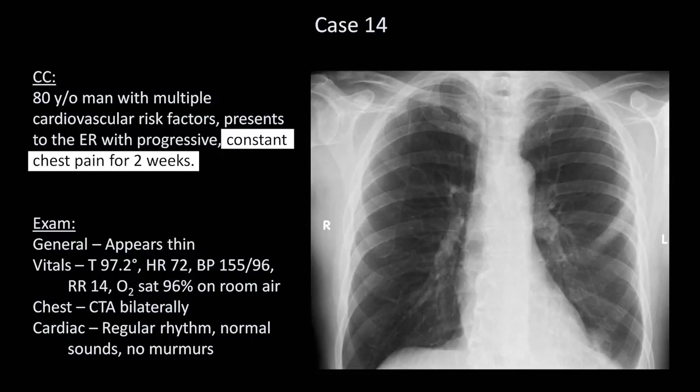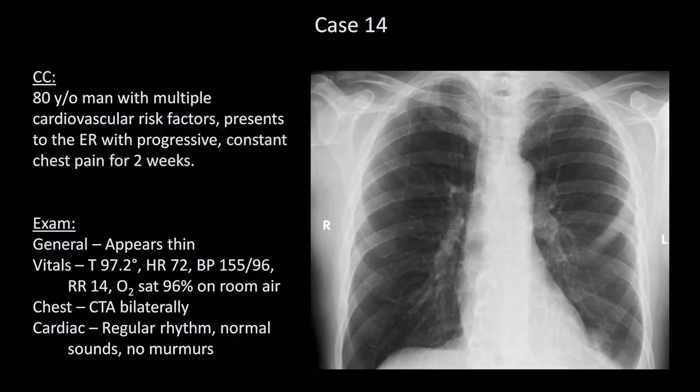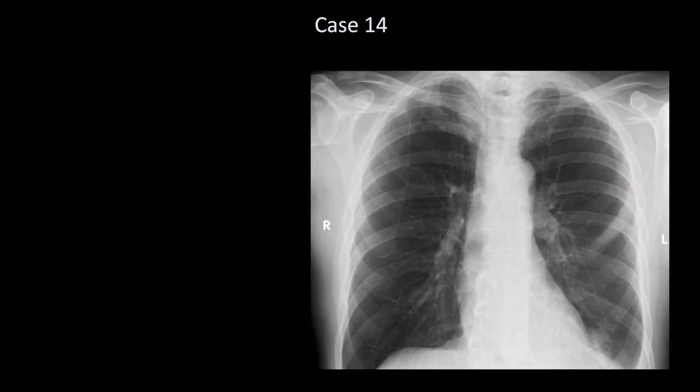This is relevant because with an acute MI ruled out by history, other less common causes of chest pain all become more likely, which would prompt a much closer inspection of the initial chest X-ray. And if we are being good about going through the film systematically, when we get to the B for the bones, we might notice something abnormal. This rib here, specifically the anterolateral portion of the left fifth rib, appears brighter than the others. It's subtle, but not equivocal.